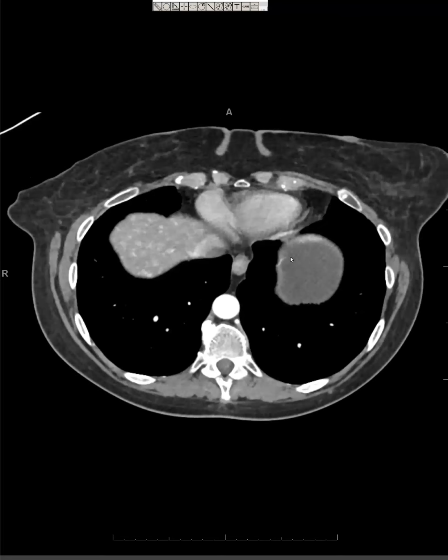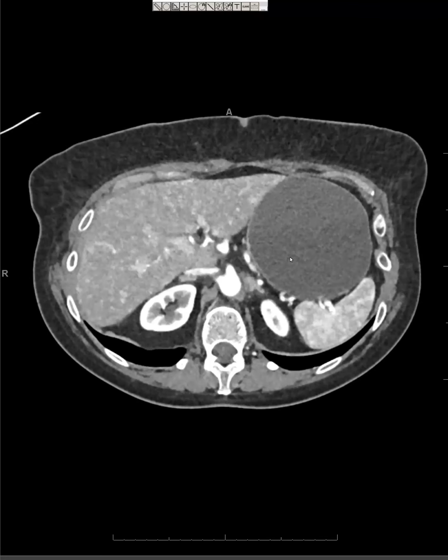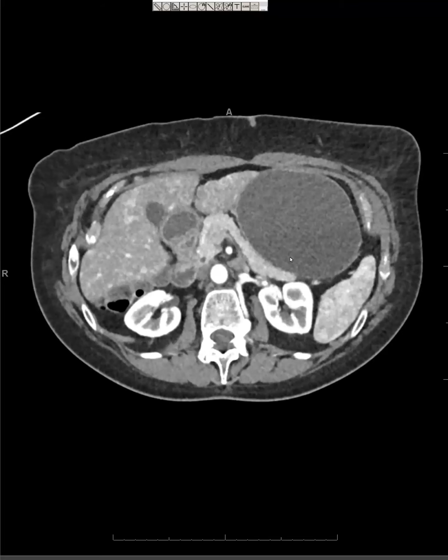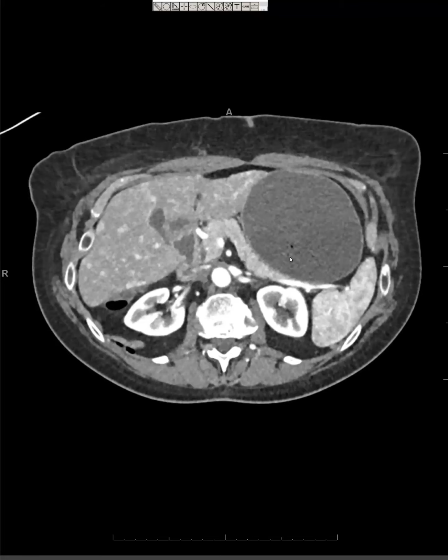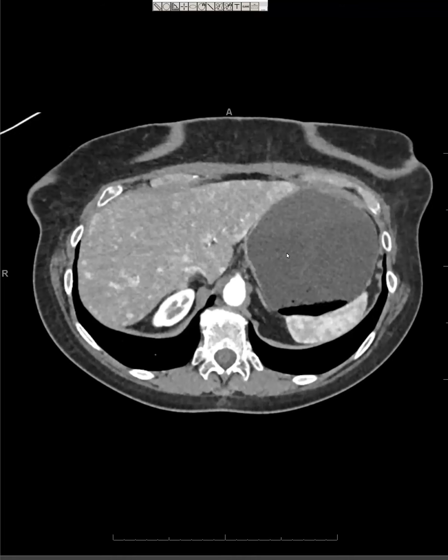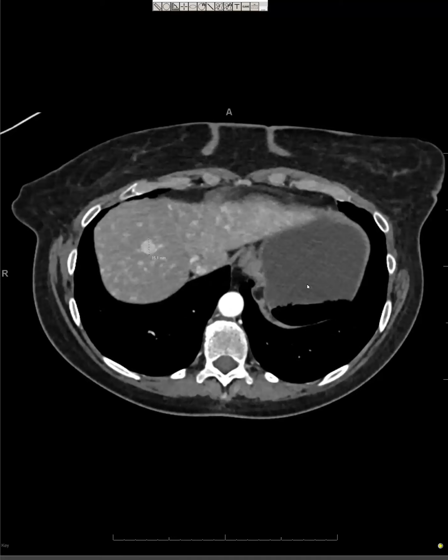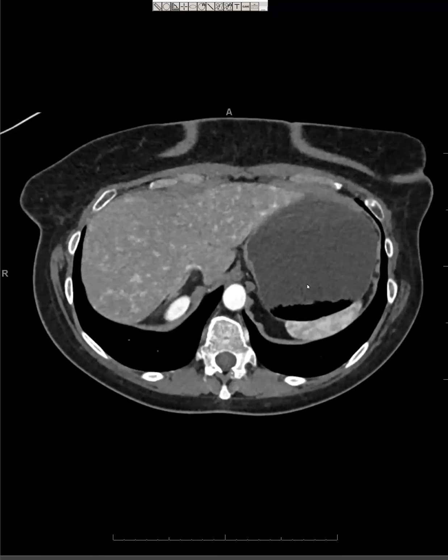But anyway, they said, hey, there's something funny about this liver, and I looked at it and said, yeah, there is something funny about that liver. I had ideas about it, but I wasn't sure until I looked in the chart. HHT. Yeah, exactly. So there are all those little vascular shunts, but the hepatic artery also looks prominent, which is a sign of HHT.